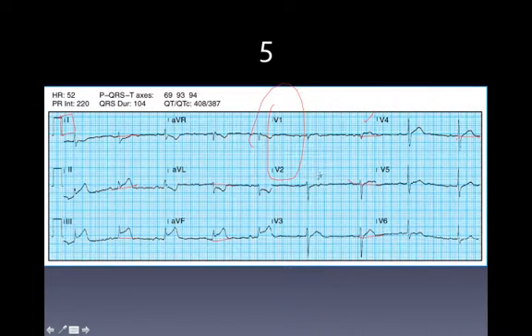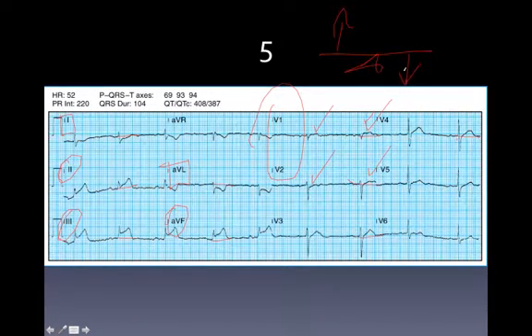It depends on which one you look at. You look at this QRS, it's not elevated. You look at this QRS, and it is. Same way with this. The ST segment in this wave looks smaller than the ST segment in this wave. However, I can still report an MI. I have elevation in 2, 3, and AVF, and depression in 1, AVL, and my V leads.